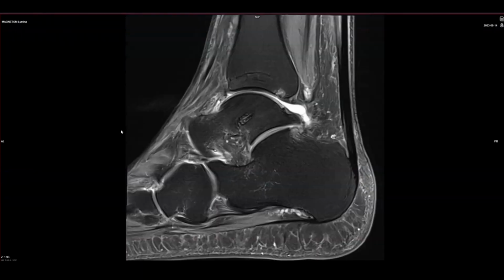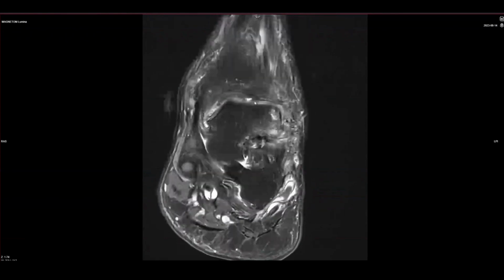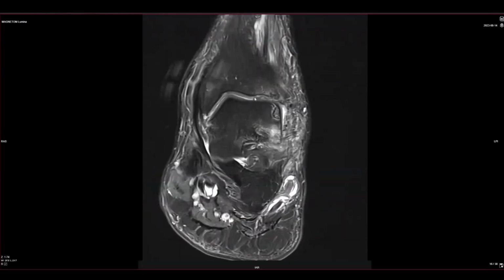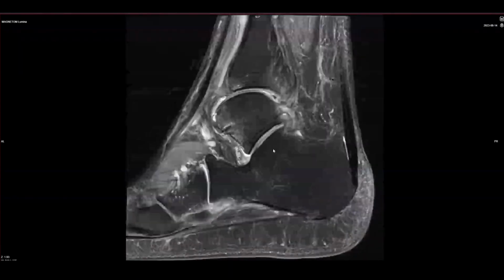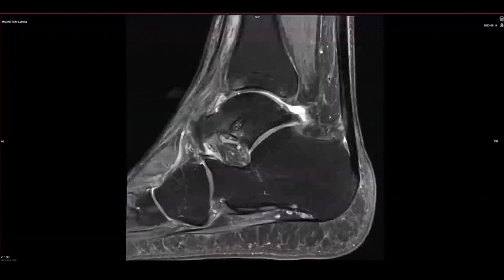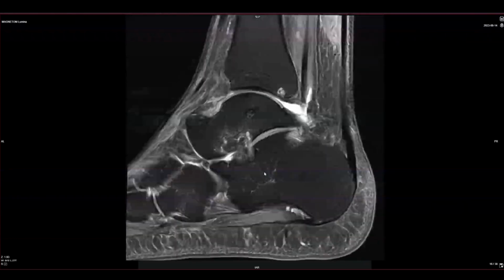Let's see what they did with this osteochondral defect here. It's kind of hard to tell post-surgically, but it doesn't look worse. There's some defect, there's some edema, but I kind of see that they actually closed a bit of the gap here. And without joint distension, it can be hard, and I wouldn't go on to do that. I would check the surgical report, because I think they may have just even debrided the cartilage there.